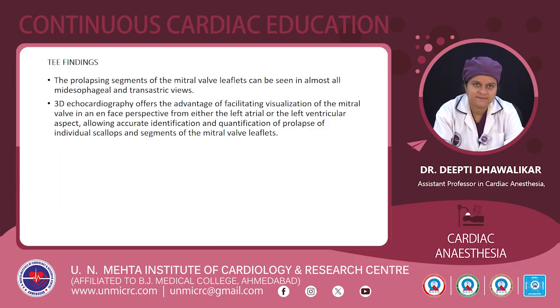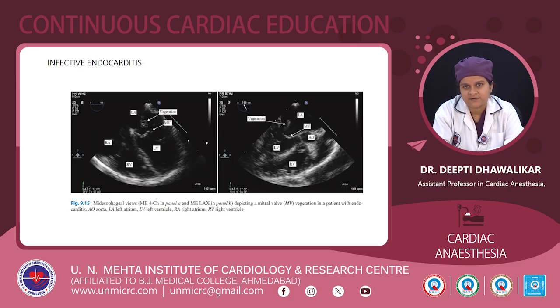TEE findings. The prolapsing segments of the mitral valve leaflets can be seen in almost all mid-esophageal and transgastric views. 3D echocardiography offers the advantage of facilitating visualization of the mitral valve in an en face perspective from either the left atrial or left ventricular aspect, allowing accurate identification and quantification of prolapse of individual scallops and segments of the mitral valve leaflets.